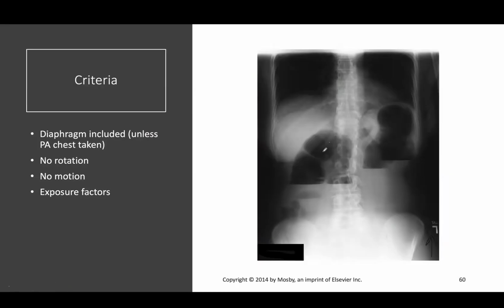And this is our x-ray here. So we see the left marker, even if it's upside down, it's right there. They've drawn an arrow on there to indicate that it was upright. And you can even see, imagine our water balloon, right? Here's the fluid level here, and then here's the air level there. You wouldn't be able to see it like that if the patient was in a KUB supine position. It would all just look kind of like this color. So again, this is important. And then notice how they got the diaphragm on there. So if there's free air under there, they could get that.